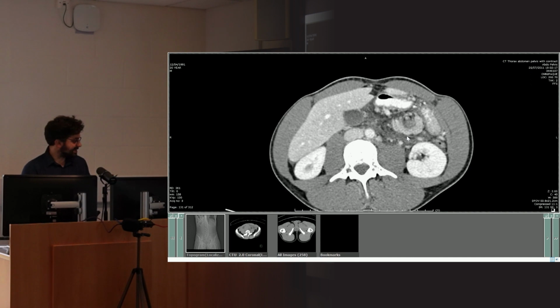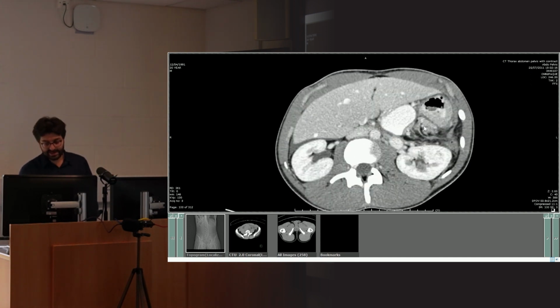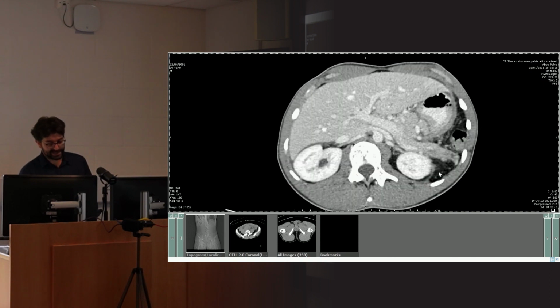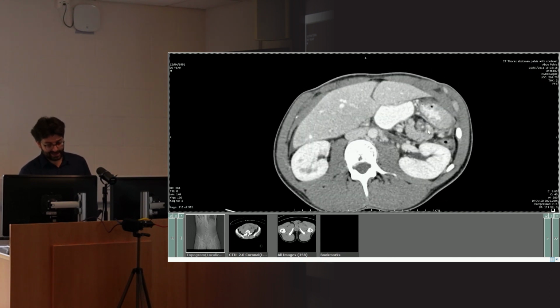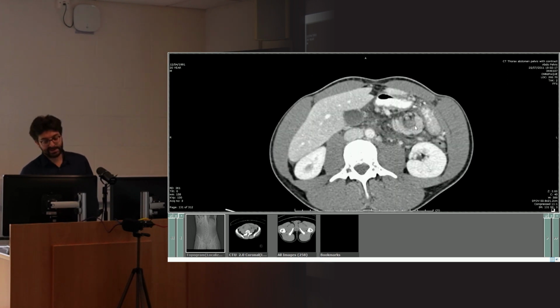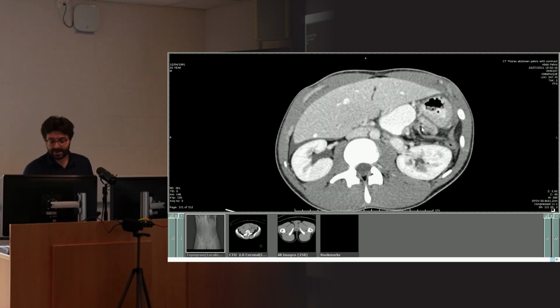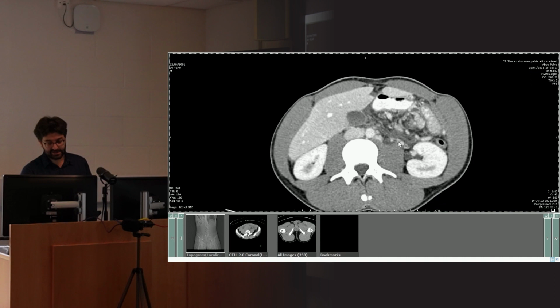Yeah, you guessed it. That's the pancreas. So this here is a spiral pancreas that this patient has. And this spiraling tells you that the spleen is definitely torted, because the vascular pedicle of the spleen, which obviously contains the splenic vein and the pancreas, is also spiraling around and around and around.